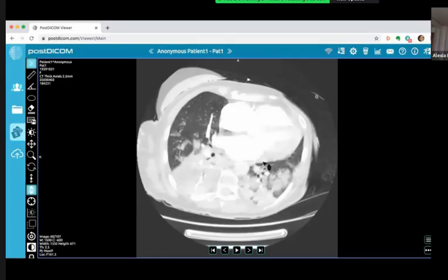So this is a non-pulmonary cause of ARDS, an extrapulmonary cause. In this case, it was hypovolemic shock. So it's lung damage resulting in leakage of fluid into the alveoli and the interstitium, leading to non-cardiogenic pulmonary edema.